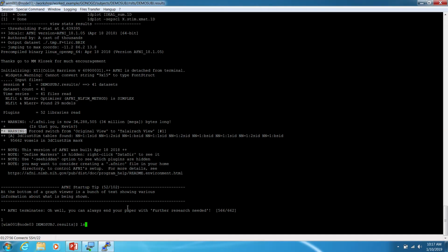Okay, so this is the end of the QC review piece, and we're almost out of time, but I want to show you just really quickly this epi review. So I've been extolling the importance of looking at your raw data. One piece that you miss in the SS review is you don't see visually what happened in your experiment. So what epi review does is it takes a look and it'll show you the real functional data that happened in a course over time.